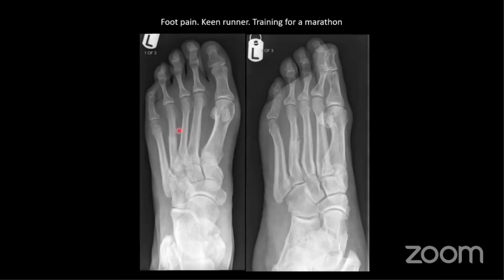Periosteal reaction, when it comes to fractures, implies there's healing and callus formation going on. It's quite common in people who do lots of sports, particularly people who have started doing a lot more running than they used to, that they can get stress fractures there. It's commonly the third and fourth metatarsals. But basically anyone with this kind of history, if you see any cortical irregularity, like this fluffy appearance here, even without cortical lucency, periosteal reaction would make you suspicious of a stress fracture or healing stress fracture.